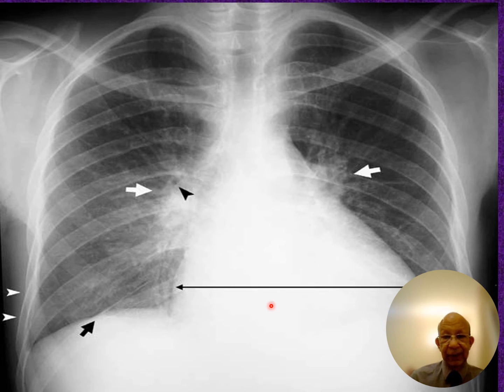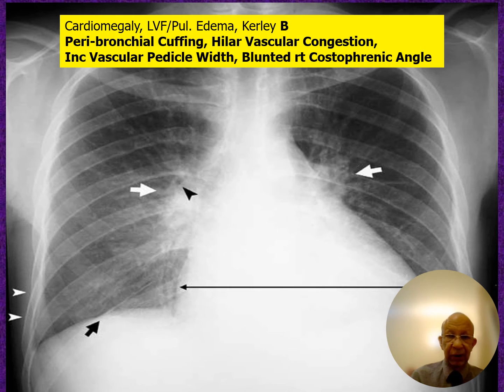Okay, so this patient has pulmonary edema, and you can see almost the start of a butterfly pattern on the right side here. Okay, so several rules have been broken. The cardiothoracic ratio, right? The hila that are now engorged and convex. The costophrenic angle is no longer sharp and deep. Okay, so all of these are suggestive of pulmonary edema.